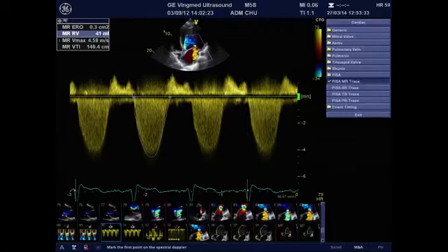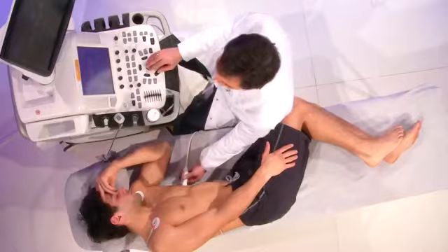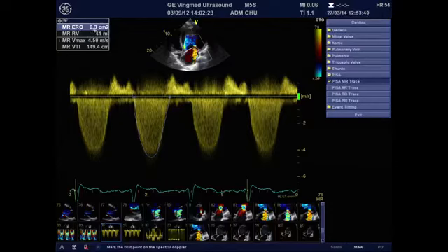But in case of secondary MR, due to the disease of the left ventricle, and also I will show you the shape of the flow convergence zone and the regurgitant orifice, it has been shown that a value greater than 20 for the effective regurgitant orifice area is prognostically important, and we should probably consider an effective regurgitant orifice greater than 20 as indicative of severe mitral regurgitation in the context of secondary mitral regurg related to the ventricular disease and the severe remodeling of the left ventricle.